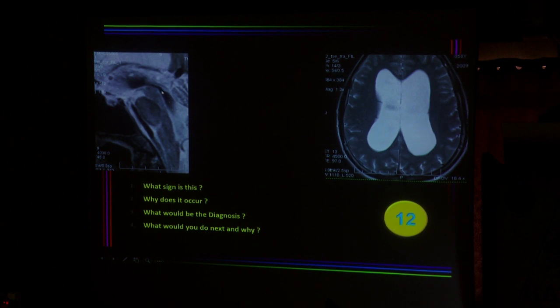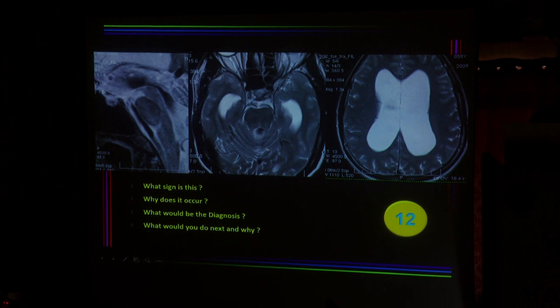This occurs due to the high velocity across the CSF aqueduct. And what would be the diagnosis when you see this pair of images? This is normal pressure hydrocephalus. You can see the dilated ventricles with ventriculosulcal disproportion. So you can do a phase contrast CSF flow velocity imaging next. And typically you can see the exaggerated CSF flow void across the aqueduct in the T2-weighted axial images, which you may not see in all cases, only in cases with increased velocity in the aqueduct.